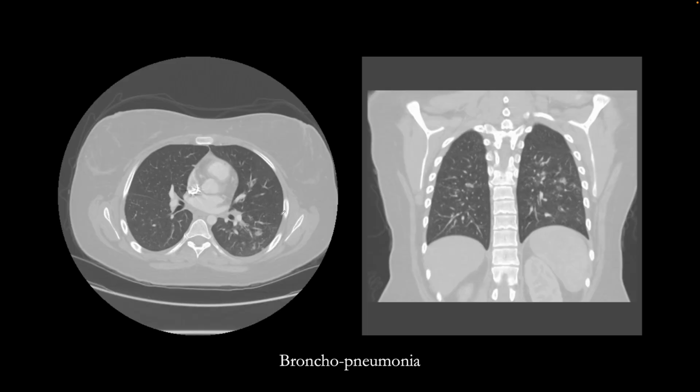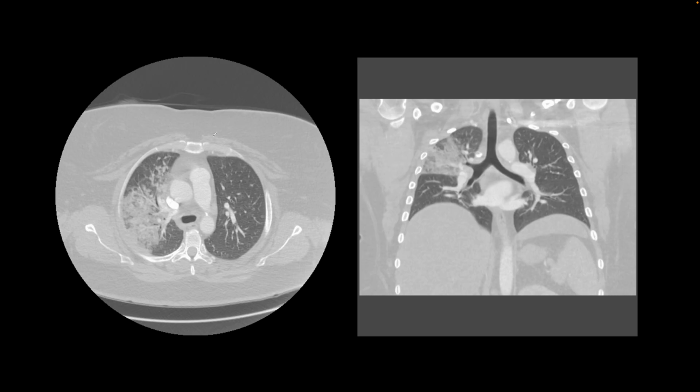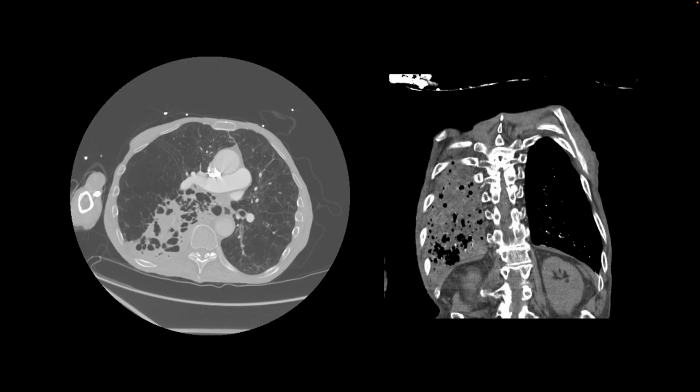This is another patient where we see developing infiltrates from bronchopneumonia. This patient has large focus of consolidation, seen right here in the right upper lung, consistent with pneumonia. This patient has pneumonia, seen as a large focus of consolidation, with destruction of the lung parenchyma seen in these foci, suggestive of a more severe form of pneumonia called necrotizing pneumonia. They also have bilateral severe COPD.